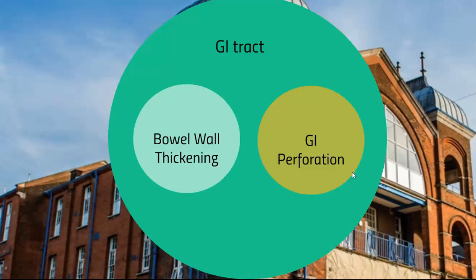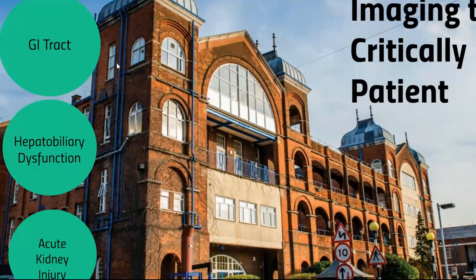So now I'm going to talk about GI perforation. In GI perforation, initial patient presentation can be non-specific, resulting in a broad differential. This can delay timely management. I'm going to show you some of the direct and indirect imaging findings of perforation.